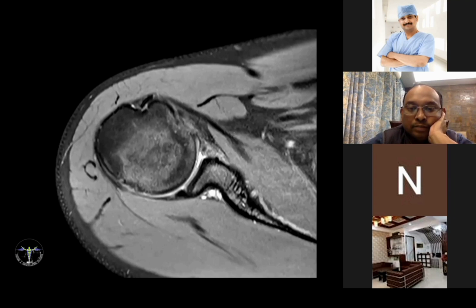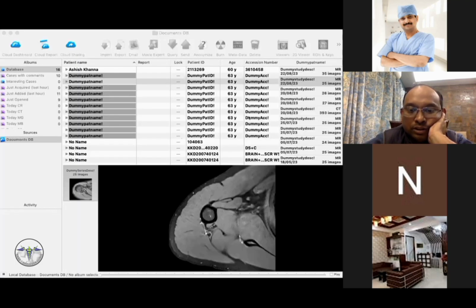But many times we don't name them specifically. It is better to describe them so that the orthopedician also understands what we are talking of. We can better explain it from the extent and the structures which are involved, or the extent from where the tear is. So this is what we prefer, rather than giving names.